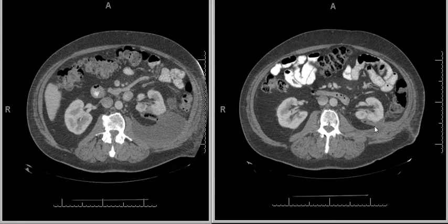Usually most of the agent is absorbed after 1 week post-op, but can persist even 1 month later, as in this case. In terms of differential, an abscess would appear as a rim-enhancing collection with a gas fluid level, and in some cases have a decreased nephrogram in the adjacent parenchymal tissue from edema. So this is an example of a Surgicel bolster for intraoperative bleeding maintenance.